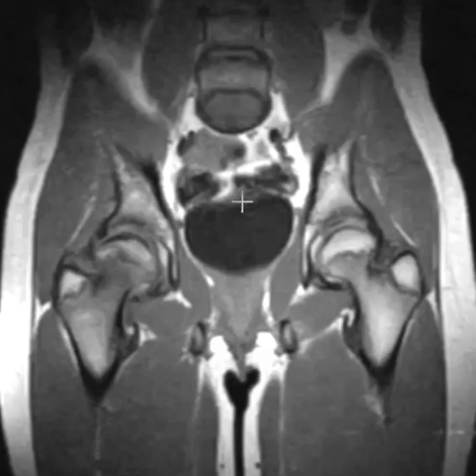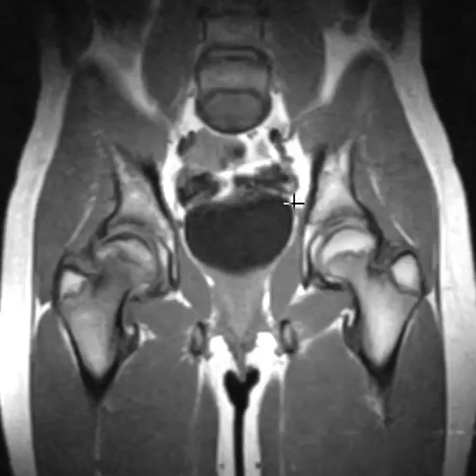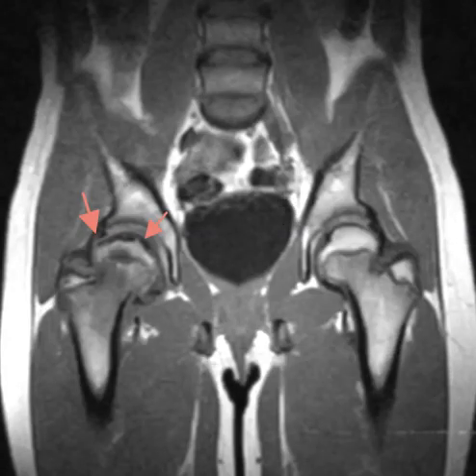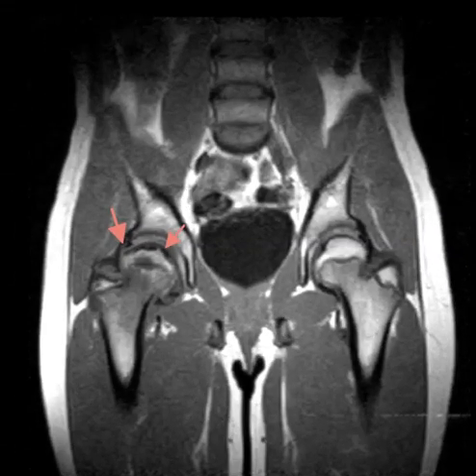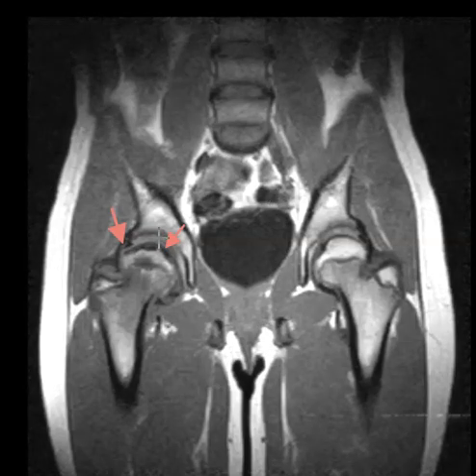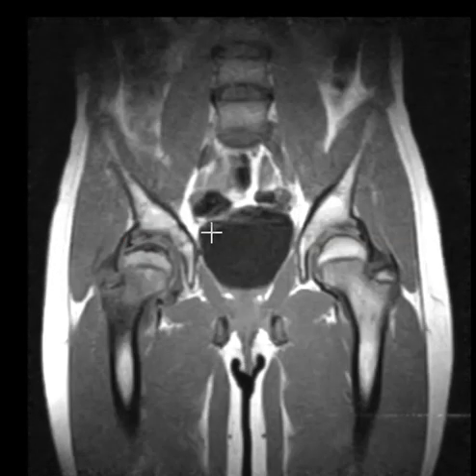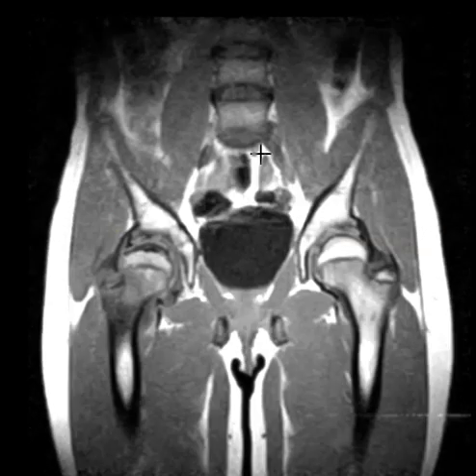The slipped capital femoral epiphysis is usually in males a little bit older, like 12 to 15 years old. This is a female, and usually those patients tend to be more obese. This is a gymnast, it's not obese, and we don't see the slip, so that does not correlate very well with that. And if you do see AVN in someone that doesn't have a case like this where they have significant microtrauma, then you can think about SLE or steroid use or some other cause for avascular necrosis.